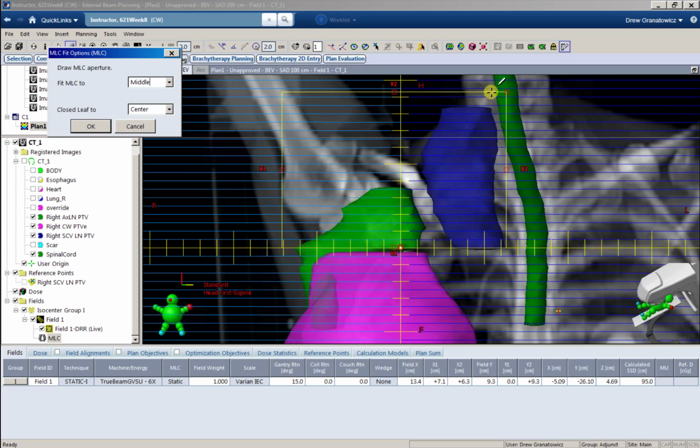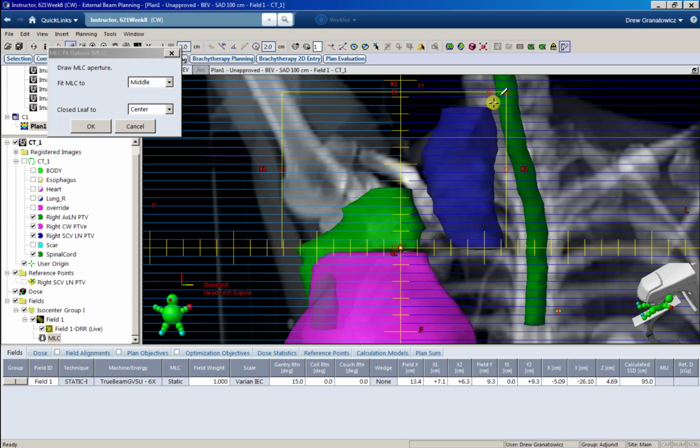And again, this is how we plan in our clinic. It should be fairly similar to how you guys plan in your clinic, assuming you plan these volumetric. If not, the fields would look pretty similar even if we set these up with just bony anatomy or something like that. But your blocks might look slightly different than mine. But kind of like our breast planning, we're going to come right to the edge of our PTV here.